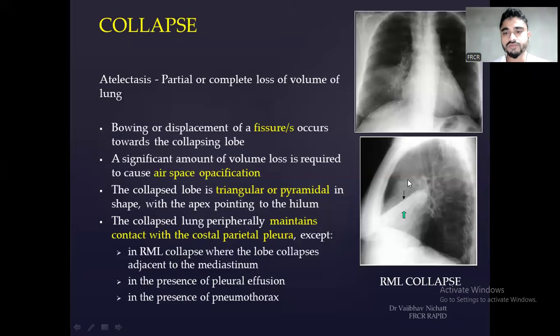Otherwise, if a lateral radiograph is not given and only a frontal chest radiograph is given, then you can say it as right middle lobe consolidation or inhomogeneous airspace opacity involving the right mid and right lower zone, predominantly involving the medial aspect.